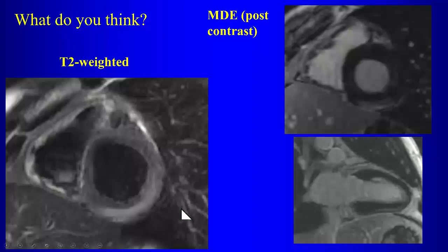And is there anything abnormal on myocardial delayed enhancement? Are there any regions of abnormal enhancement? Yeah, the same region has this area of abnormal enhancement. So is this a myocardial infarction? Yes. No. Who wants to tell me why it is not?